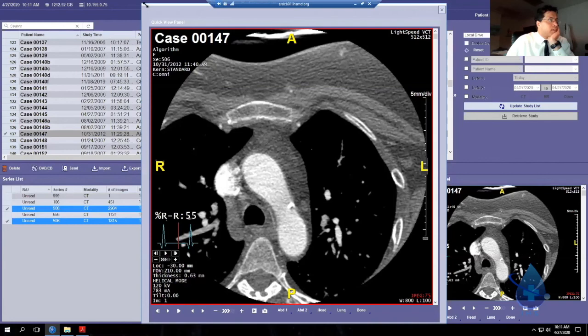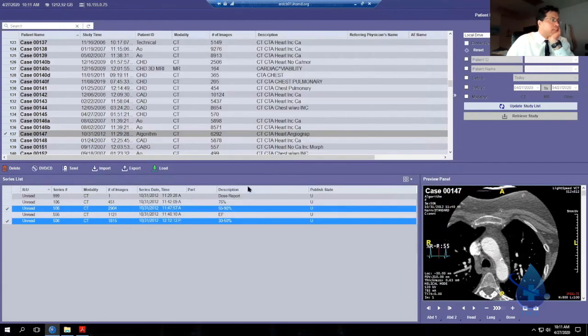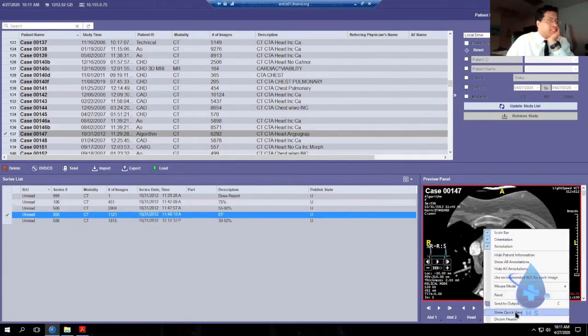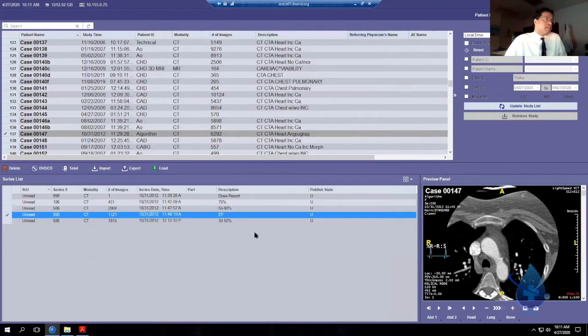If you click on the EF, for example, its slice thickness is only 2.5 millimeters. 2.5 millimeters is definitely not thin enough to see a coronary, okay? Because a coronary is 5 millimeters across, that's only going to give you two pixels, 2 boxes across a coronary. So you wouldn't use that series to assess the coronaries.